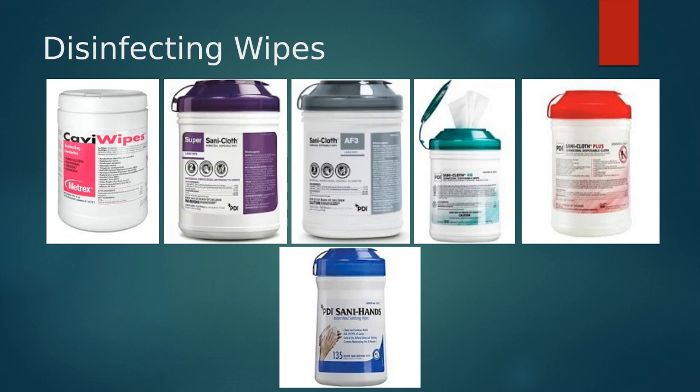They can discolor. So we don't have any at the school, but we try to use the green wipes because those cause a little less discoloration on the cords and on the machine itself. So you'll see a lot of facilities have the green wipes, and same thing with the gray. They're all just different combinations of chemicals. They're all very strong and potent, but they can cause discoloration on the machines, so just be aware of that.